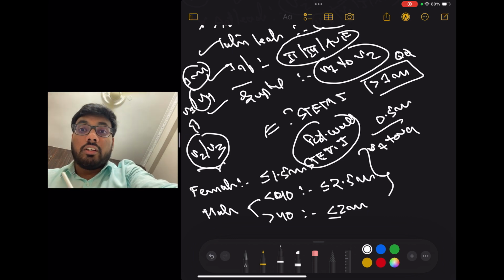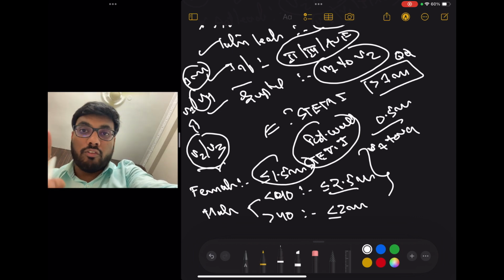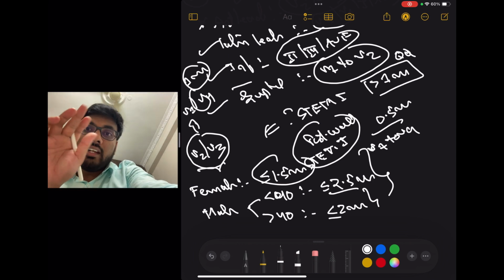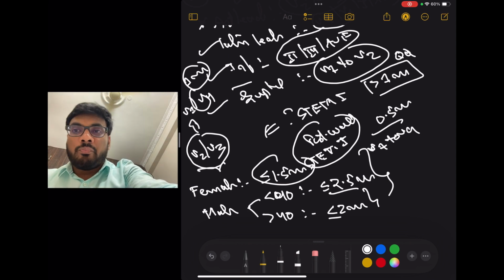Okay. So suppose a patient is having ST elevation only in V2 and V3 and it is 1 mm, then it is insignificant, because at least in females it should be more than 1.5 mm, in males 2.5 mm in case of less than 40 years, and more than 40 years at least 2 mm should be required, right? Suppose the patient is having ST elevation in V2 and V3 that is only 1 mm, but is also having ST elevation in V1 and V4 that is also 1 mm, then it is considered as pathological. Okay, right.